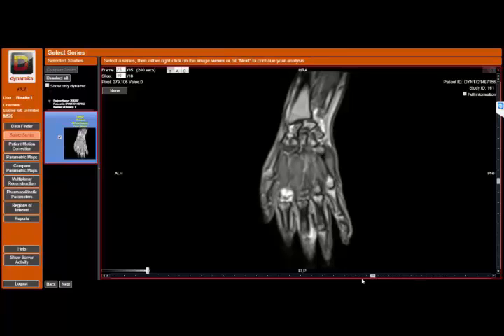I do that back and forth a little bit to get an idea of how severe the inflammation is in this patient, and also to ensure that we have in the beginning a baseline frame without contrast in it. So you can see in the beginning, no contrast. When I go through the frames, 1, 2, 3, then contrast begins to come in, 5, and so forth.